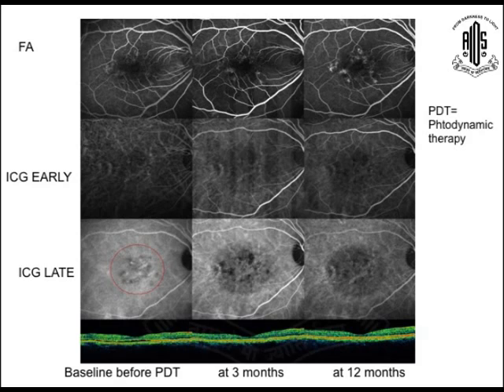If you see, this is the before photodynamic therapy, this is the angiogram, this is the early phase ICG, and this is the late phase ICG. This is the area of the PDT therapy we have done.